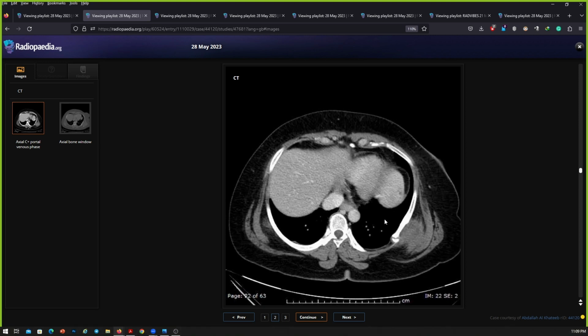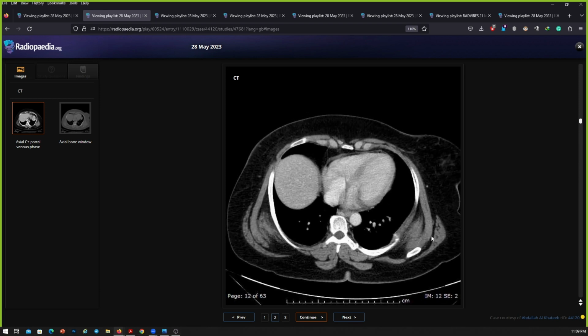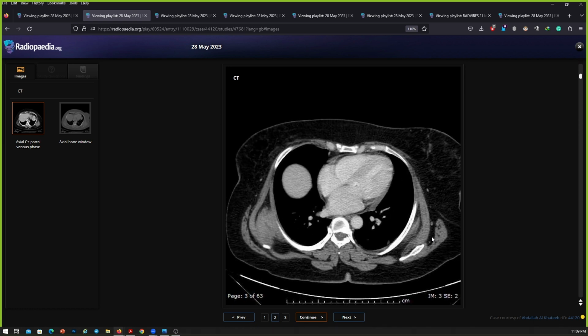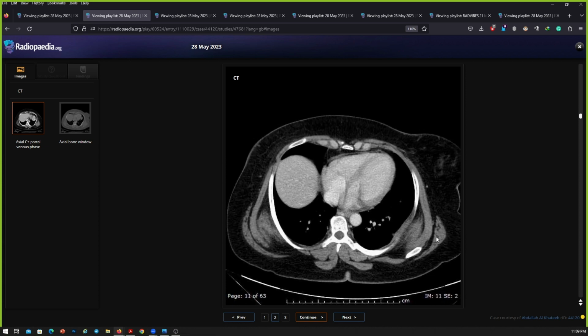So considering these, this is a post-contrast study which does not show any significant post-contrast enhancement. I am now looking at the soft tissues for any other associated abnormality. Okay, stop looking elsewhere. Could you please summarize your findings?